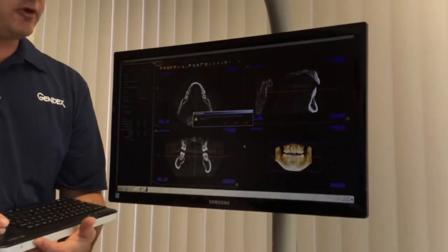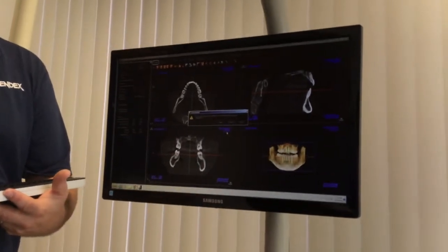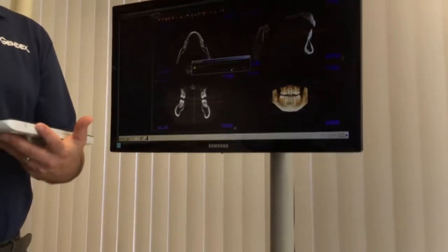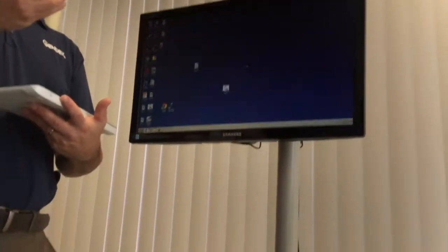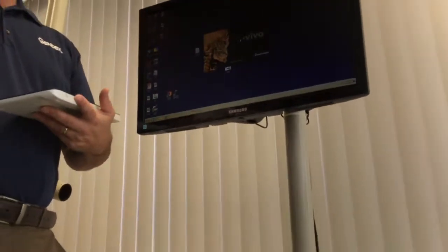So it's always going to ask you whenever you close it, even if you just saved, do you want to save or discard any work you did? So if you just saved it, just hit discard. But if you wanted to save it before you closed it, hit save. So same as like Microsoft Word or anything. Yep, so if I'm in vivo 6, double click to open.